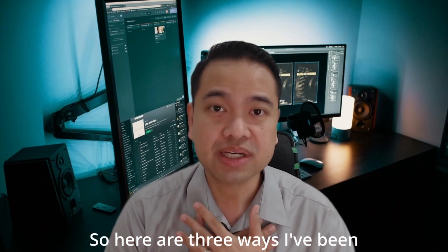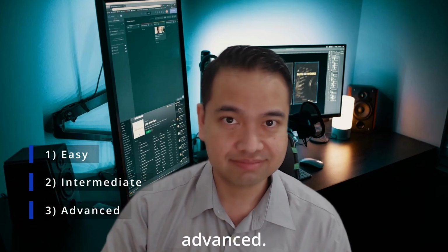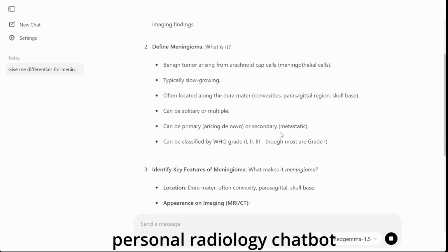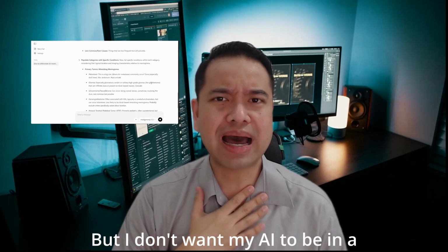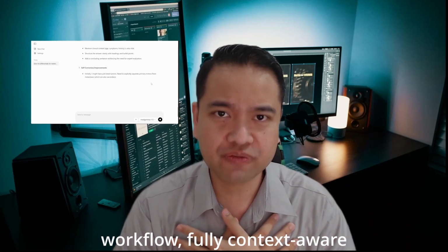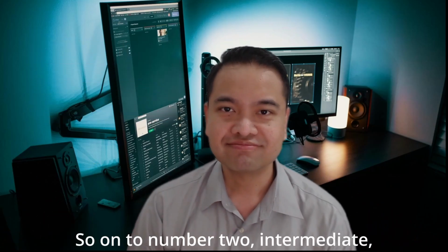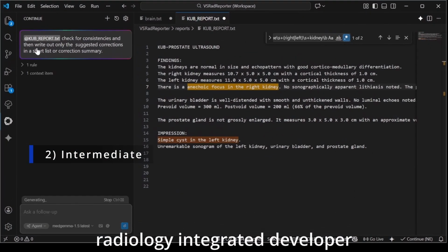So here are 3 ways I've been exploring the use of MedGemma 1.5, from easy, intermediate, to advanced. Number 1. Easy mode, the local AI chatbot. Running MedGemma 1.5 as my own personal radiology chatbot that can answer questions and give differentials. Good enough? But I don't want my AI to be in a separate window. I want it fully integrated into my workflow, fully context-aware of my radiology report, my radiology notes, or even my PDF articles in radiology. So on to number 2, intermediate, radiology integrated developer environment.